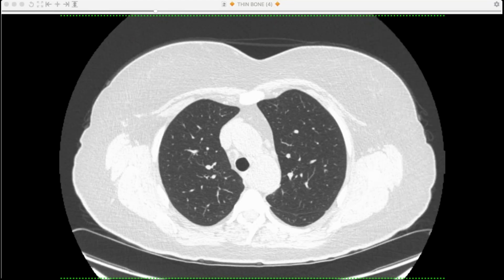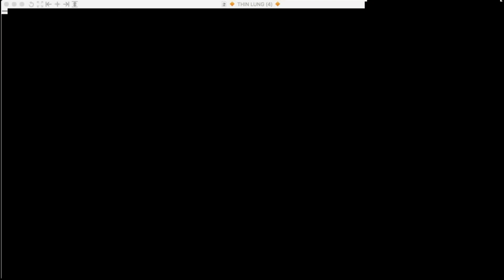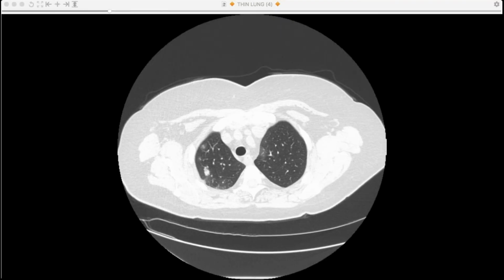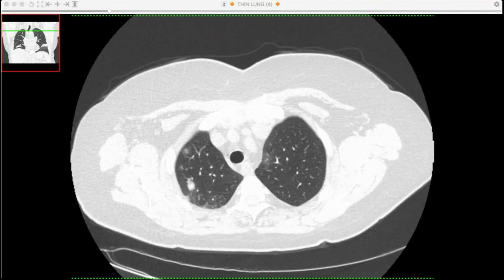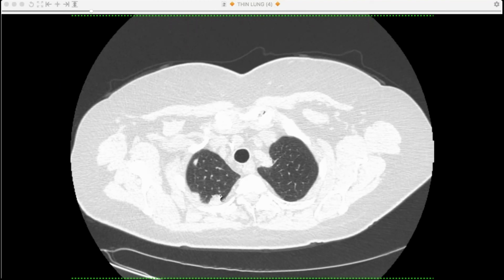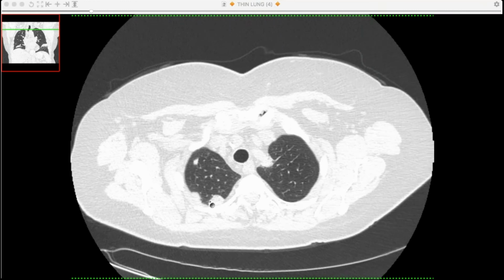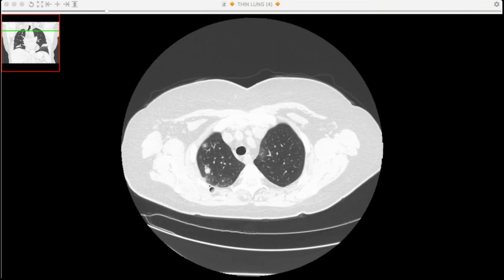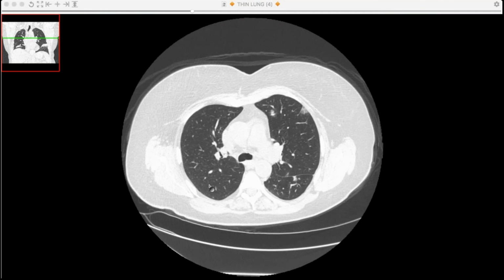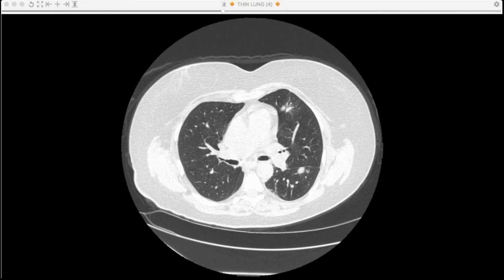But what was interesting is, the patient had tapered the steroids at that point, and then this was the scan I came across. This is about 2 months after the last one, and all of a sudden these new nodules appeared. You notice many of them morphologically very similar but smaller. You could X-Acto knife them out. They're in the periphery, predominantly along the airways, but very much a good look for organizing pneumonia.